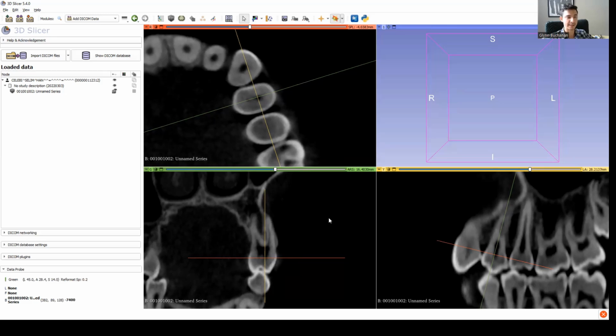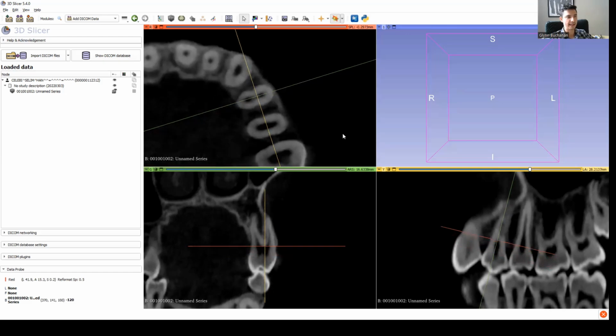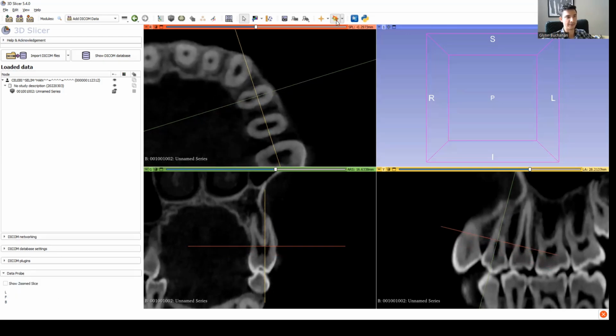So we start evaluating the canal structure, as we mentioned, in multi-rooted teeth from about the level of the bifurcation or the level of the pulp floor. So in this case, we need to actually move down a little bit. In this case, it's sort of close to the level of the crestal bone. We can also find a sort of reliable place to start. And if we pop down there, and if it's easier for you, you can actually take your annotations off. But we can see that we've got clearly two roots there. We can already see that on the coronal view.